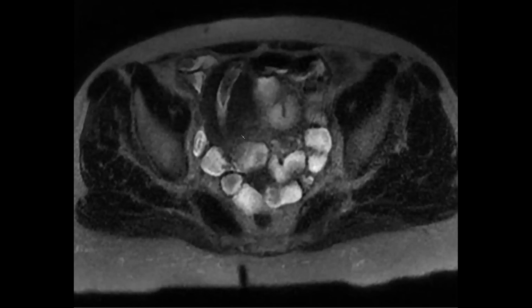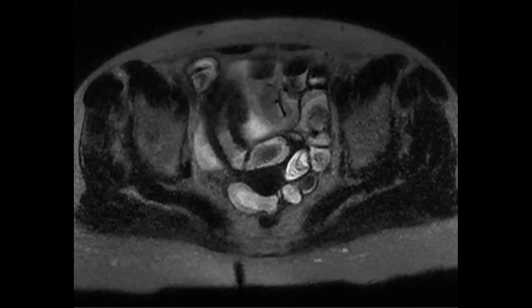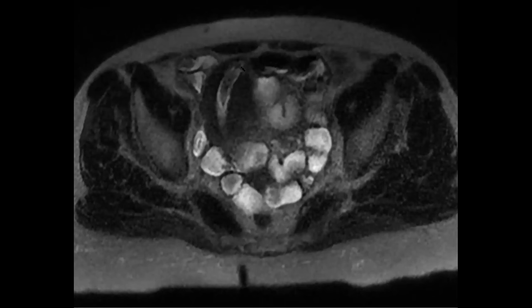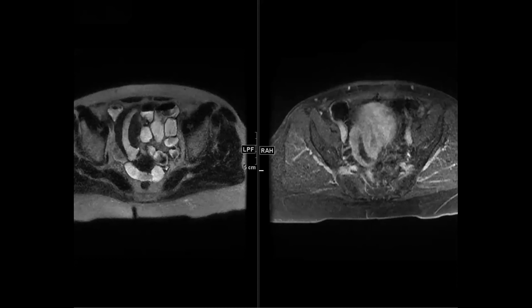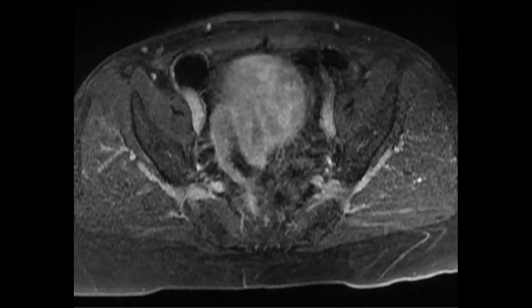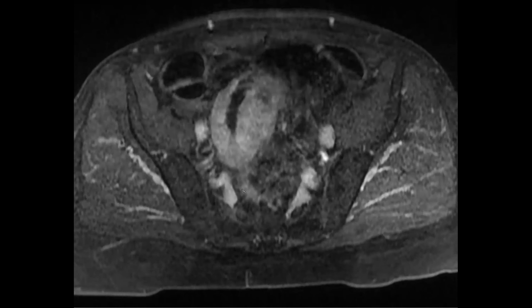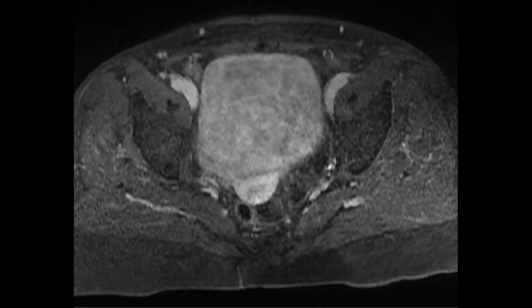Do you have the coronals? Yeah. But you can see there's like a bowel loop going into it and then coming out of it. Yeah. Probably like Crohn's disease, segmental thickening. Or like lymphoma. I mean, just soft tissue-y. Yeah, exactly. So those are the two things that we should think about.